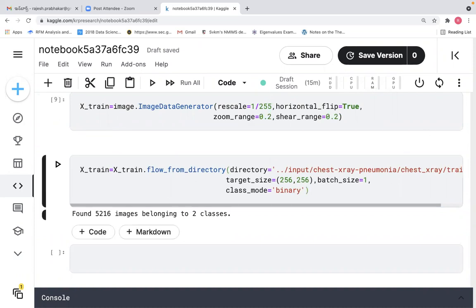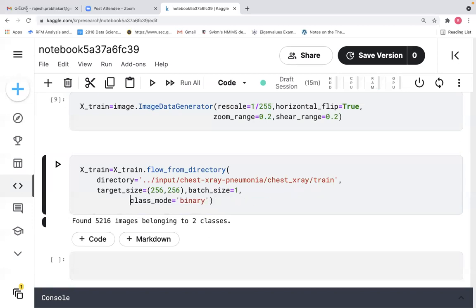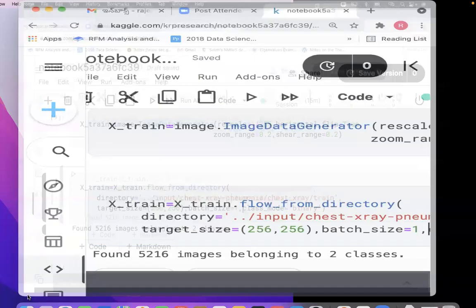Okay. Let me bring it down. Directory one more time so that everybody can clearly see it. Actually, there is a subdirectory within it. That's why it is causing the problem. I didn't see the subdirectory. Chest X-ray is another directory, right? Sir, taken it. Okay. Now I'm just looking at the problems.